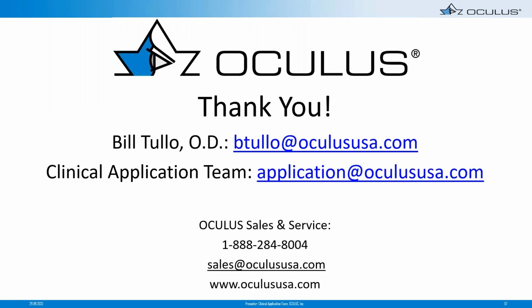And for patients who sleep with lenses or wear gas permeable lenses, I think the best rule of thumb is to see them weekly until you get consecutive scans that are within normal limits. And I use the compare 2 scans display to see if I have any significant changes in both my tangential maps and my elevation maps, just to make sure, again, that the corneas are back to their normal state.